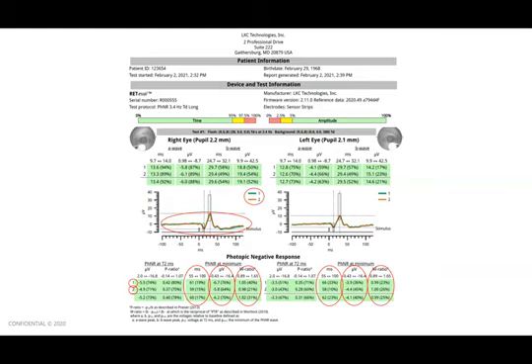This is another measure I would look at over time. If that W ratio is getting lower over time, less than 1, then I would be concerned that the retinal ganglion cells or the retinal cells are stressed and are being damaged. So that would be an indication to me that in a glaucoma patient or a glaucoma suspect, they could be getting worse.